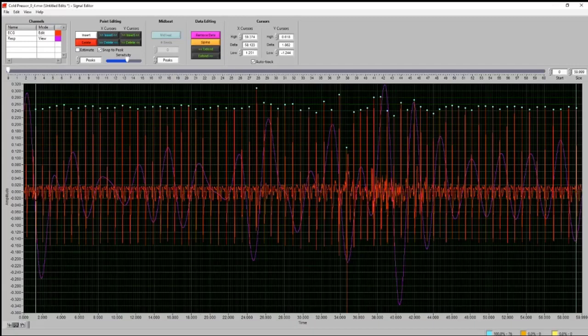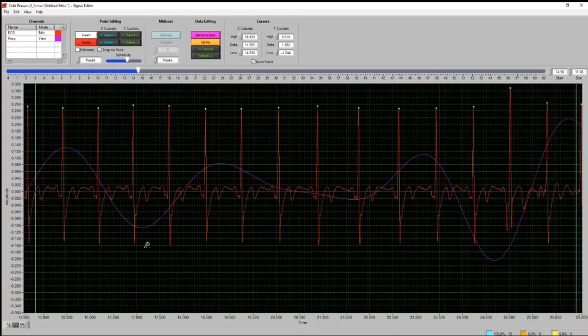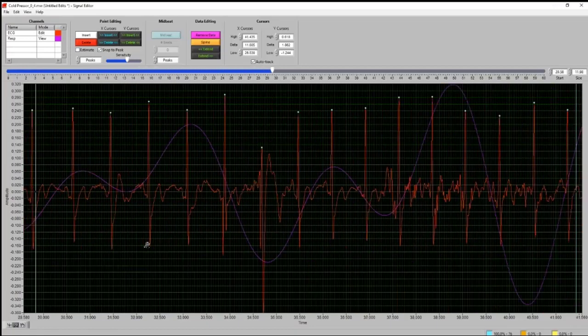Now I'm going to zoom back in, and we'll just continue on, and then we'll wrap up the ECG editing for today. So right here, this doesn't really look like a normal ECG to me. I mean, that certainly looks like a peak, which could be that. But it could also be this person expressing some sort of ectopic physiology once again. And we don't want to include that unless we're absolutely 100% sure that that's a good beat. So we're going to remove that, delete it.